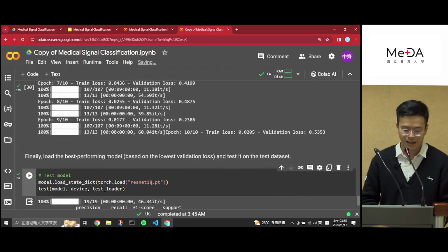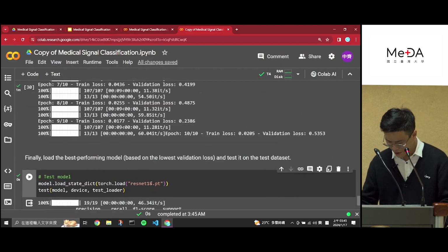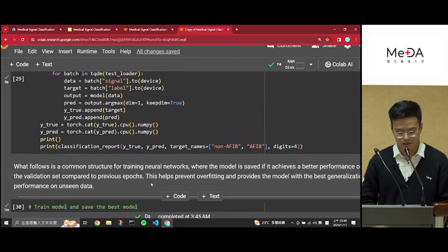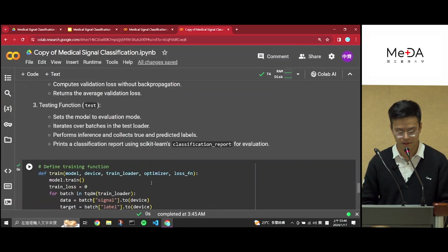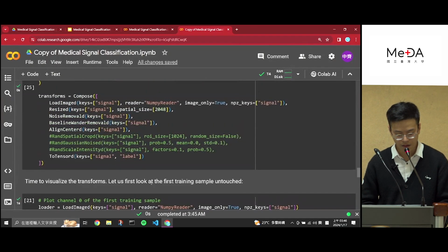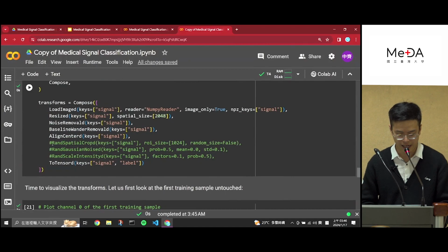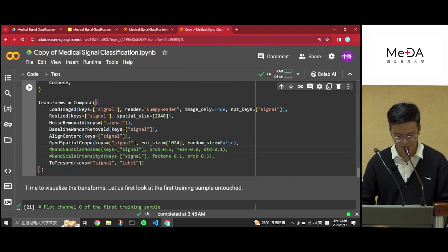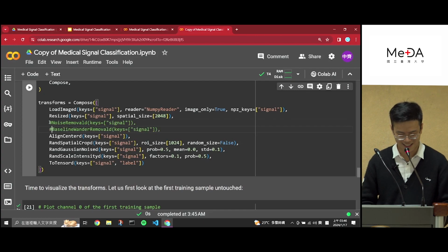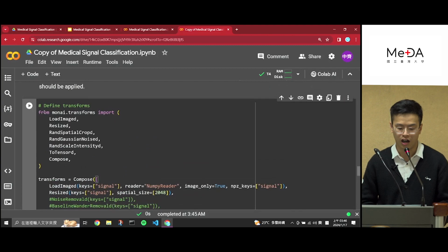So that's okay. So what you can do here, because we have 5 minutes left, is try to do some mix and match on the transformers here. For example, if I add random into it, and if I just remove these standard practices for some reason, and then run all below, right?